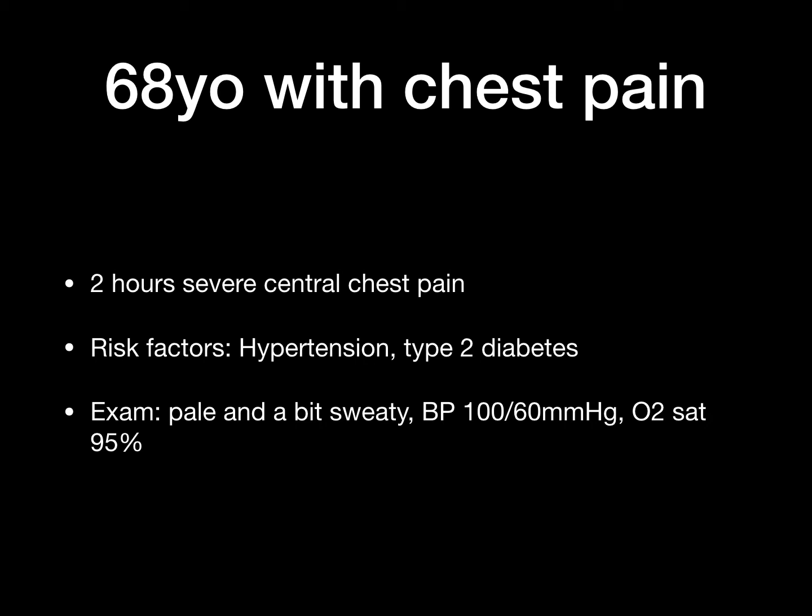So the really useful thing here would be whether there is an ECG to compare to. Sometimes we have this available and sometimes we don't, and what we're trying to decide then is whether this left bundle branch block is new or old. Often the reality is that it's difficult to get access to those ECGs in a timely manner, and if you don't, you'll just have to assume that this is new left bundle branch block with typical chest pain.